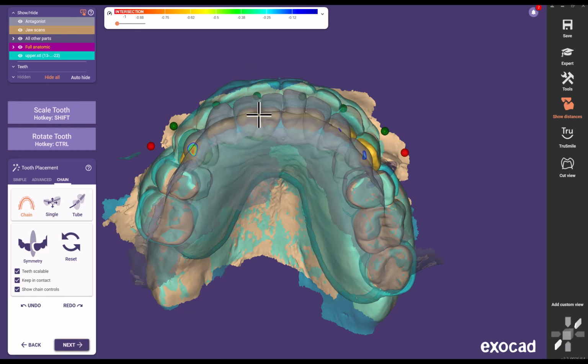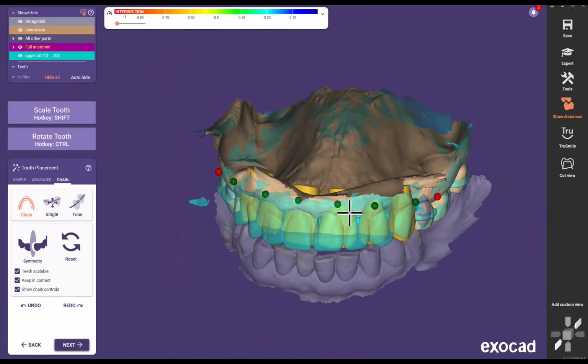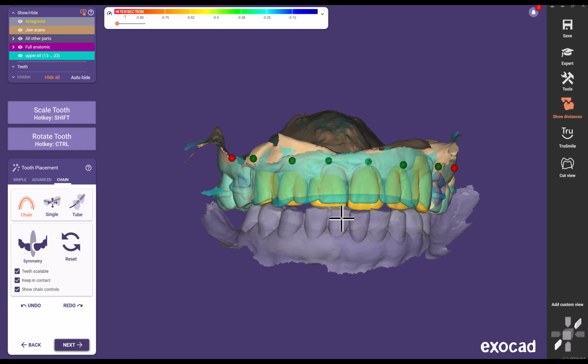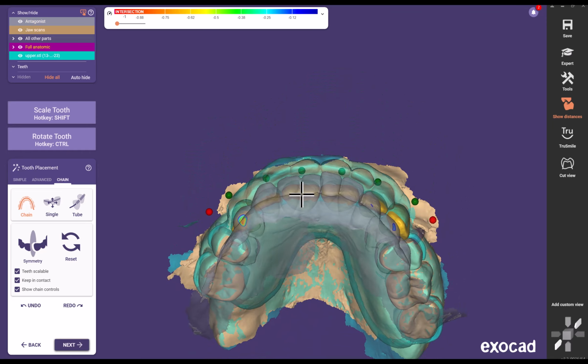And these current centrals on the partial are way too small. I mean, I'm just looking at that relative to the lower incisors. So for sure these teeth need to be larger, and they're by necessity going to be larger, just given the fact that they've got to extend way out here.